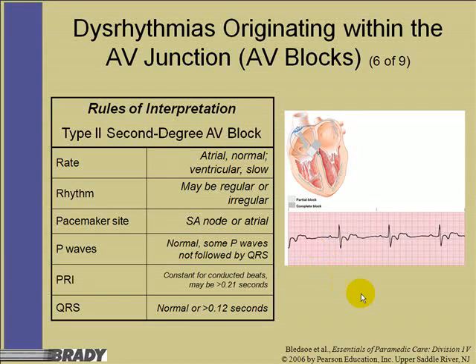And what I'd like to do is, if I had a piece of paper, I would measure from this P wave you see here, that little bump is a P wave, to this P wave, and measure across, and then I can predict my next P wave. So there's my next one, there's my next one, there's my next one, and there's my next one. So we just follow all across. So we've got atrial depolarization, but it's not catching or capturing in the ventricles.